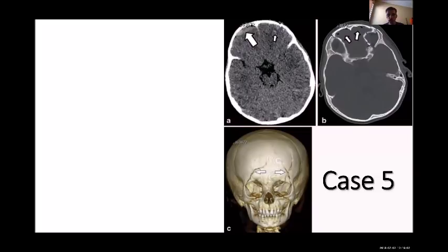What can you describe, Ilham? Can you describe rather than give a diagnosis? Remember, always describe. Don't give a diagnosis because you will be wrong. So don't jump to diagnosis, but try to describe what you see. Even if you don't know the term, just describe it as you would describe your dress or when you buy shoes. Just describe it.